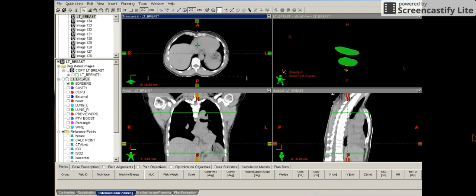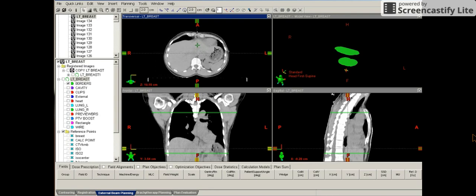So here's the medial and lateral wires still, and we're approaching the most inferior slice. It's right here. So once again, we can see a large wire denoting the inferior border of the breast tissue, and then we place the border contour on the whole CT scan. So we have two contours for the border, and that's the superior and inferior.